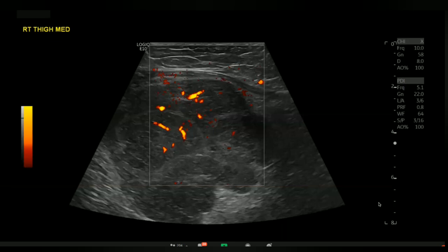Okay. What about its echogenicity? Its echogenicity, it is hypoechoic. Hypoechoic as compared to what? To surrounding muscle. Sir, muscle and what's on top there? Sir, tendons, subcutaneous fat. Subcutaneous fat. Yes. Why is that important for me? Sir, it means it's not of fat density.